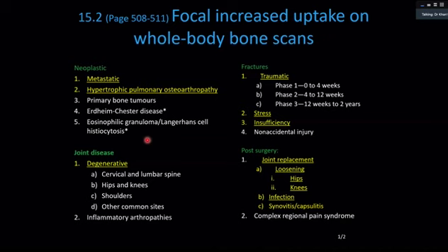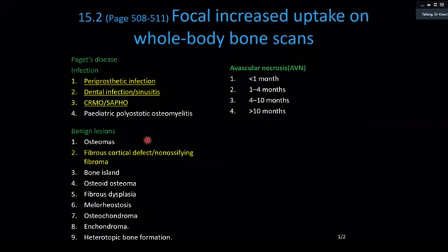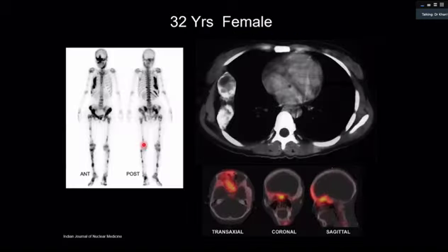So here, please remember that fibrous dysplasia, when it is in the active form, radiologically speaking, will be lytic with a bit of ground glass, but complete ground glass will not be active. It will show uptake.